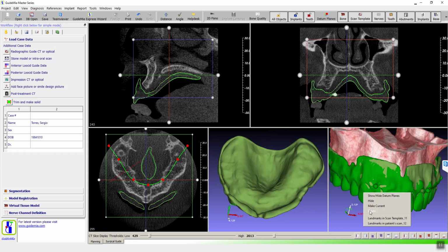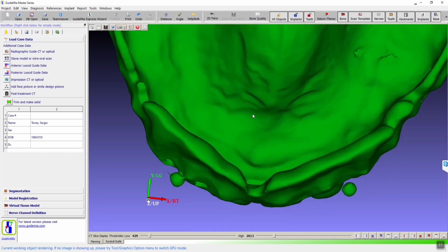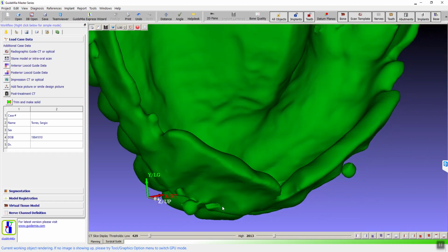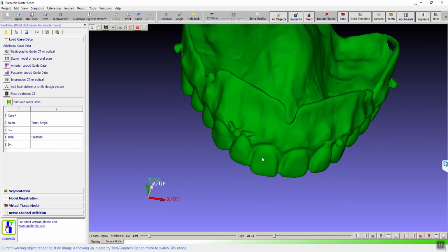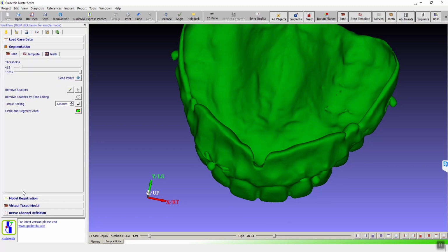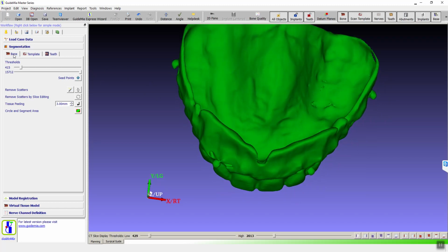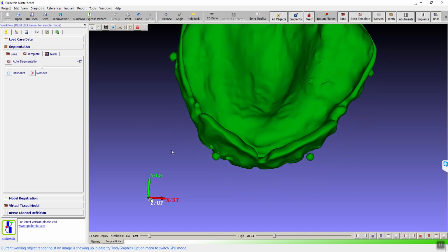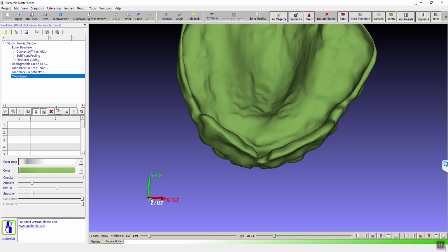So I'm going to right click on this, make it current. So we see this. If you look at those areas, those artifacts or geometries tend to cause trouble for Boolean operations. Actually, let's try to fix those. I actually shouldn't have skipped that step. So we go to the segmentation page. In addition to the bone structure, we have this tab for a template. If we adjust the threshold value for this, oh, sorry, because I loaded this one already, let me delete this.